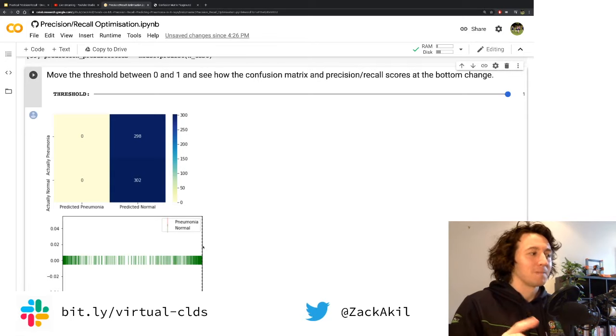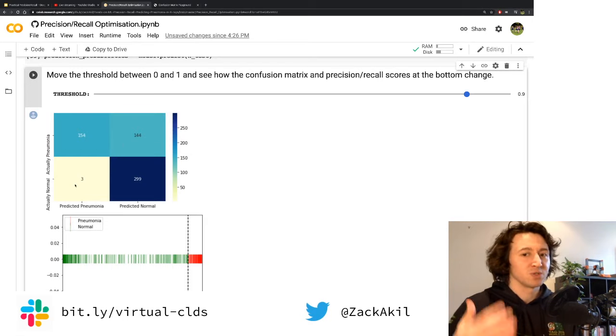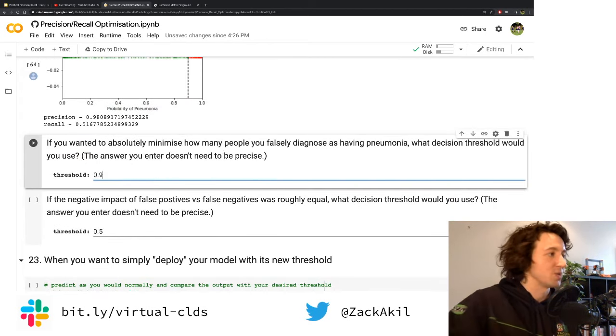Technically, our precision is perfect. It's not false, but you can clearly see this is no longer a machine learning model. This is just a catch-all if statement. So a score of 1 isn't going to help. 0.9 seems good. We minimize those. Yes, we get a lot of false negatives, but the task was to minimize the false positives. So a high threshold. 0.9 worked for me.